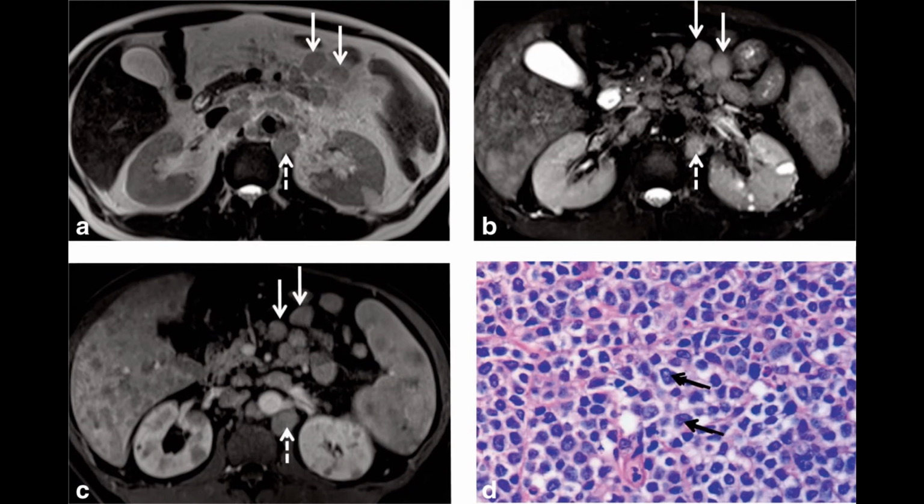In this case, what we are seeing is this: in this T2 weighted image, there is one hypointense nodular lesion. See, very bulky lesions. If you see in T2 fat saturated images, they are appearing brighter. Here it is appearing hypo compared to the fat, whereas in the second image, B image, we can see that they are bright compared to the rest of the image because of the fat suppression that we are seeing.